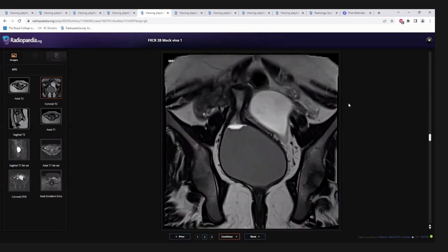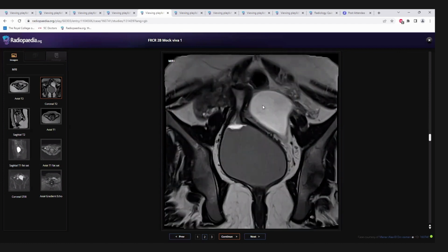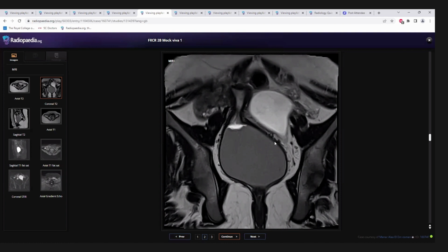This fluid distended or blood distended structure seems to have a connection with the uterus superiorly with fluid level. So this is a hematocolpus. Hematocolpus with the normal uterus. There is no congenital anomaly of the uterus. So I'm reviewing my diagnosis. This is a case of hematocolpus.